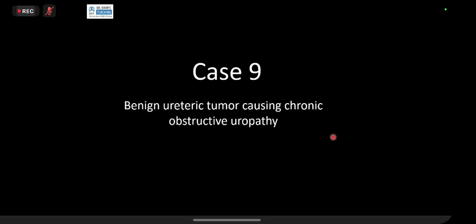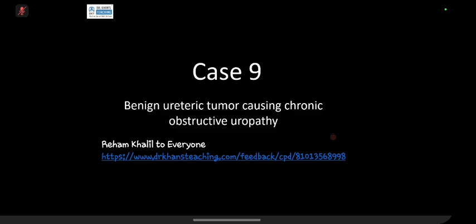Now, first of all, in the exam, and this is a very important point, when you say that there is enhancement, you must say that you want to see a non-enhanced scan to check for enhancement. The same thing will happen in the gut, for example, in bleeds, or the aorta. You have to ask for a non-enhanced scan. Without that, you cannot say that it is enhancing.